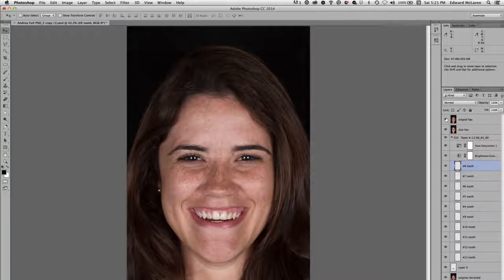I'd like to make your centrals a little bit longer at the incisal edge as to blend, and same thing with the laterals. And then now you start to get into the discussion with the patient. And so this is basically how you do it. All right, now let me show you a couple of other little tweaks.